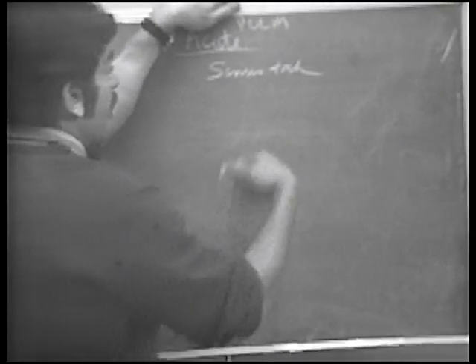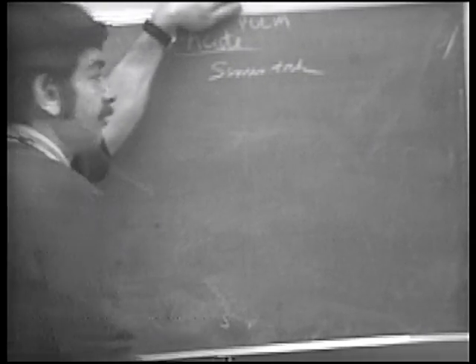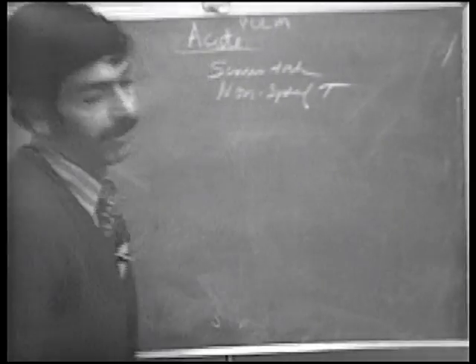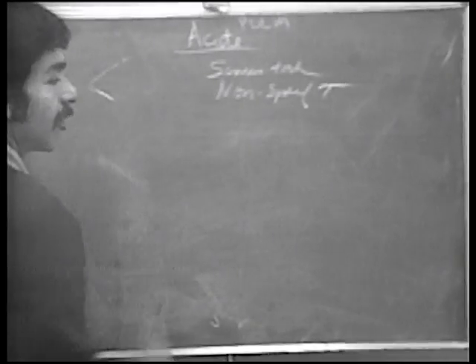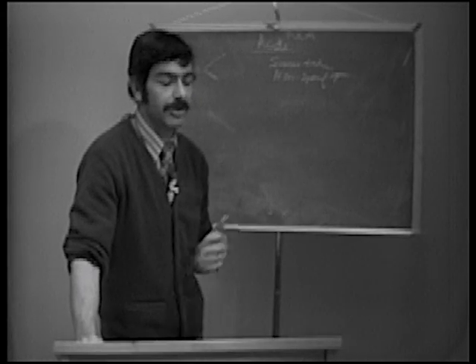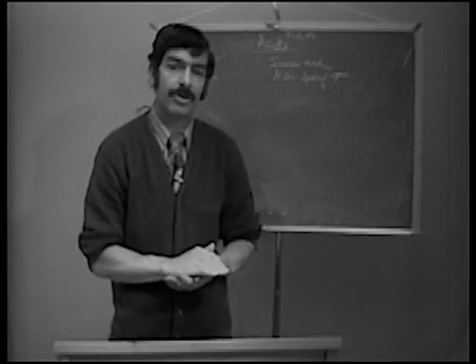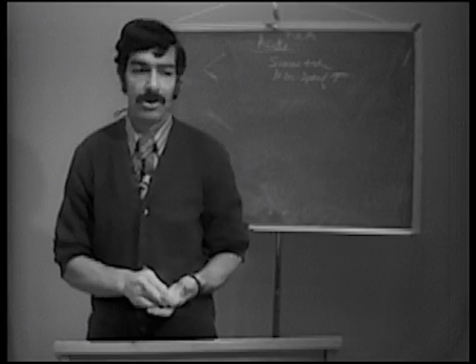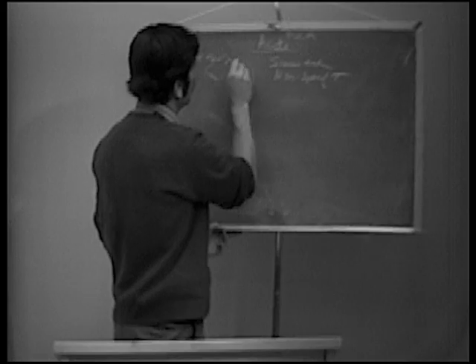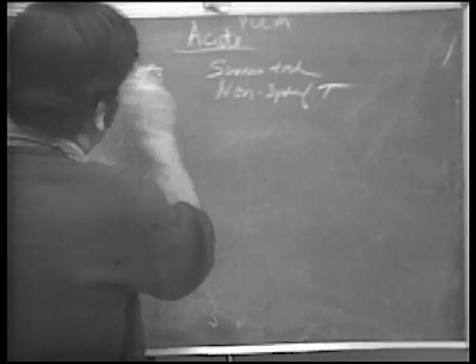and you might see some atrial irritability, very nonspecific. And also you get nonspecific T-wave changes. And these are seen in most of the patients. I'd say probably 75% of the patients get these very, very nonspecific changes that are really not that helpful. But in a relatively small percentage of the patients, maybe 30% or so, you see the more specific changes. So we have these that are nonspecific, and these that are more specific.